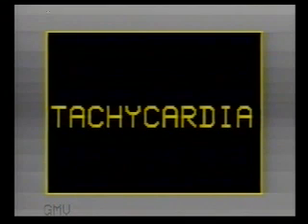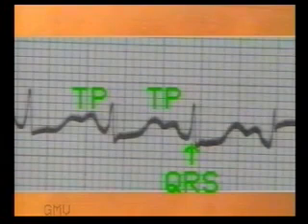Tachycardia. Tachycardia has to be differentiated mainly by its origin, whether it is sinus tachycardia, paroxysmal supraventricular tachycardia, ventricular tachycardia, or atrial flutter fibrillation. First we have to see whether the QRS complexes are normal or abnormal and whether P waves are present. If the QRS complex is normal, it means that the origin of the tachycardia is above the AV node, sinus or supraventricular tachycardia.